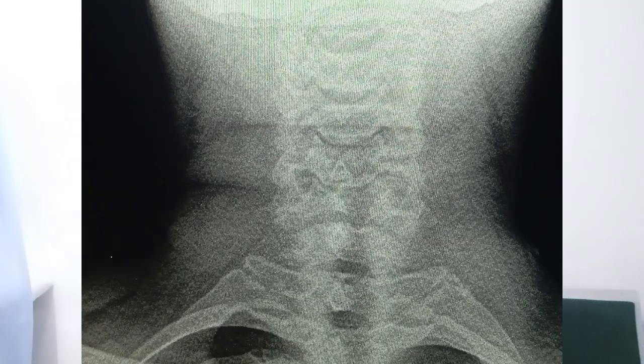Now, for someone that doesn't have any physical symptoms, it's better for the person to know what to watch out for, which is what we do for that particular patient. The space between the vertebrae, the circle, is reduced compared to the other one. You can check it, but we can see a reduction in that particular part, which is a possibility that the person might come down with cervical spondylosis in the future.